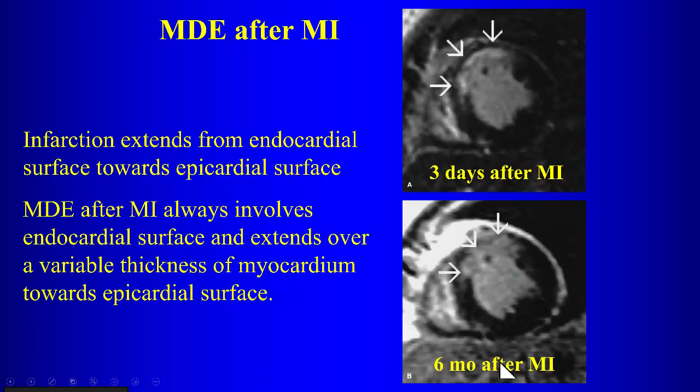And then 6 months after myocardial infarction, there's still myocardial delayed enhancement. It still enhances. So acutely, it's because the gadolinium is just leaking out into the interstitium because of the damaged cells. Chronically, it's because the scarring forms in that region, and scar does enhance.